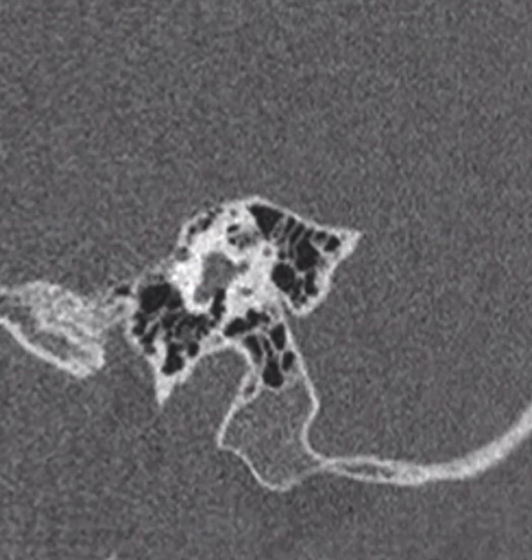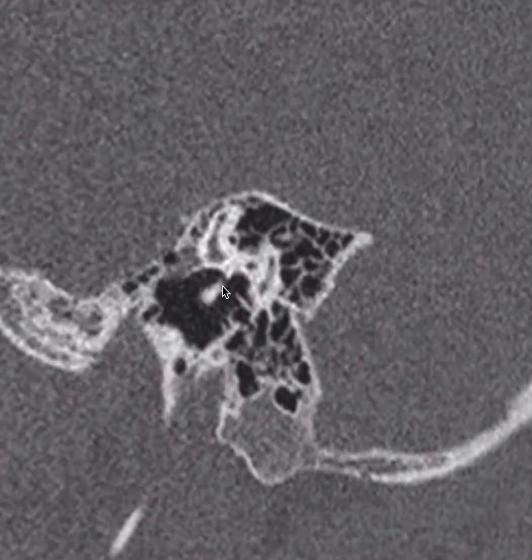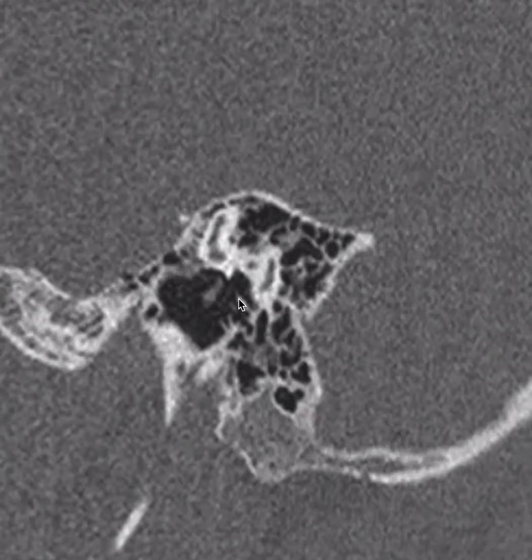Here on sagittal CT, we can view these same structures. Our round window niche is seen right here, going up to the level of the round window above. Posteriorly is our subiculum. As I scroll laterally, we see the subiculum in continuity with the cochlear promontory, and we see an additional bony projection coming superiorly off the cochlear promontory called the ponticulus. As I scroll laterally, we see that the ponticulus above and the subiculum below form a partial anterior wall covering this space. This is called the sinus tympani.